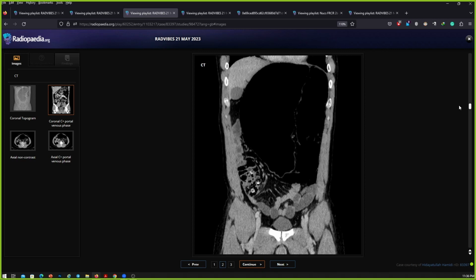So the rectum appears to be collapsed, as well as the descending colon, and there is a twisting seen at the level of the sigmoid colon, and there are also no haustral markings seen in the dilated bowel. So my most likely diagnosis is a sigmoid volvulus. This is a surgical emergency. I'll immediately pick up the phone and inform the referring clinician, and this patient needs to be referred to the surgical team for further management.